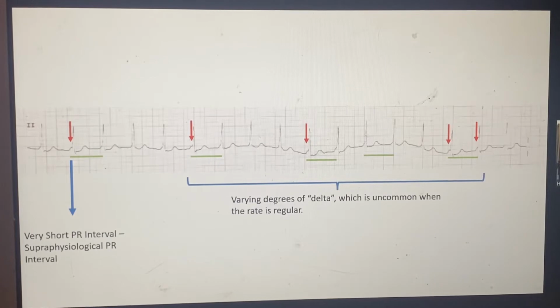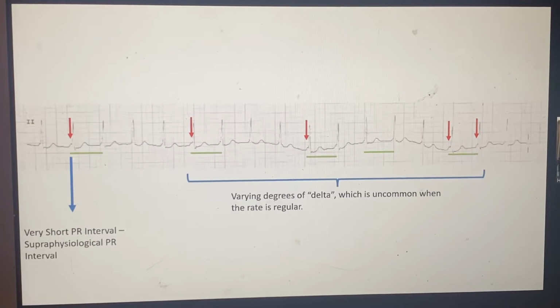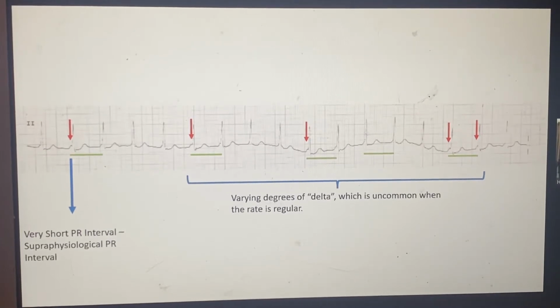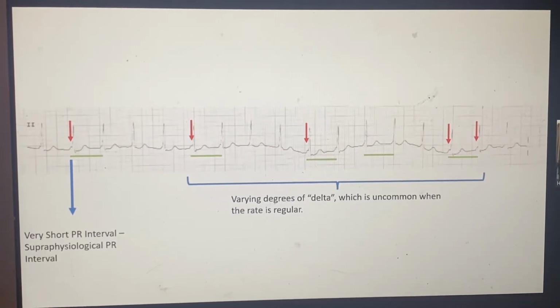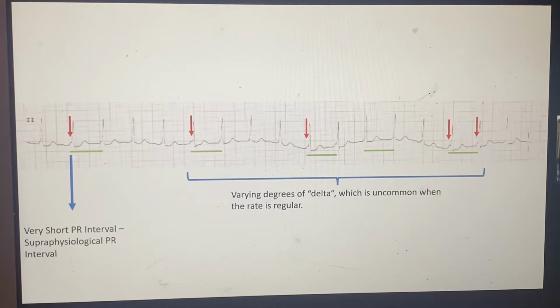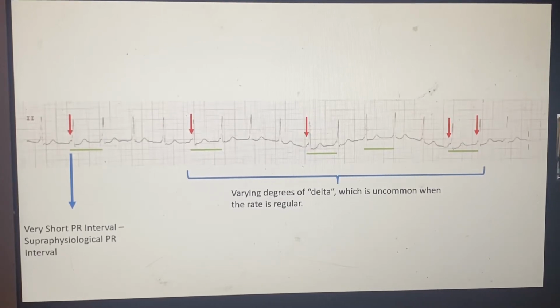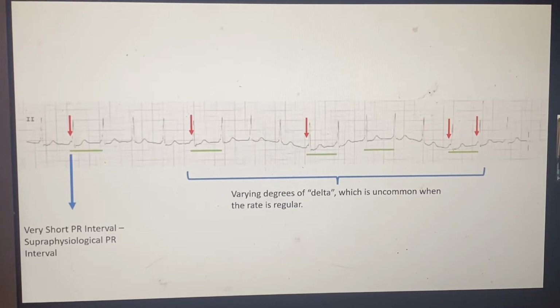I think isorhythmic dissociation can be, of course it can be, but for me isorhythmic dissociation is a diagnosis that you make when you cannot differentiate, when you have no maneuver to differentiate. It's a finding on the ECG, but it's our job to actually differentiate what it is. I don't think I gave isorhythmic dissociation as an answer, because that would be very ambiguous.